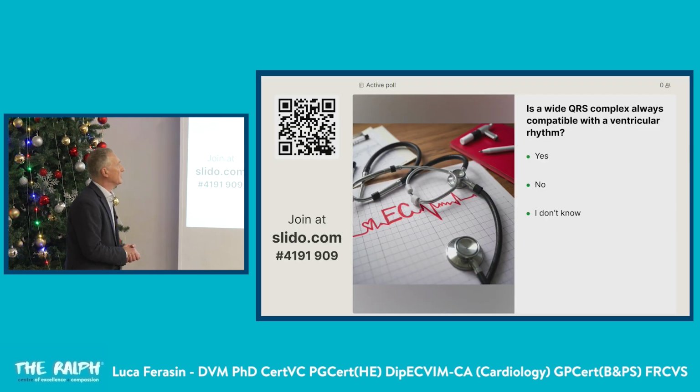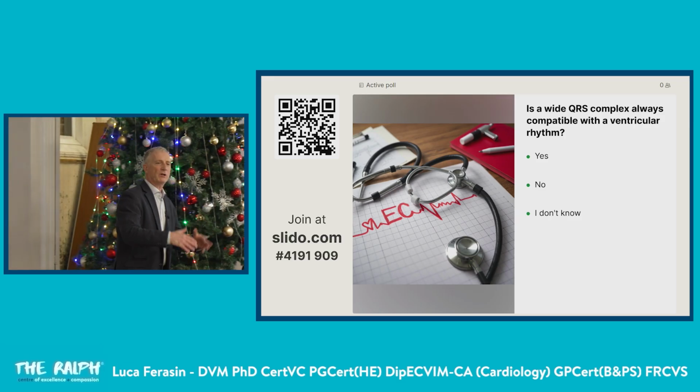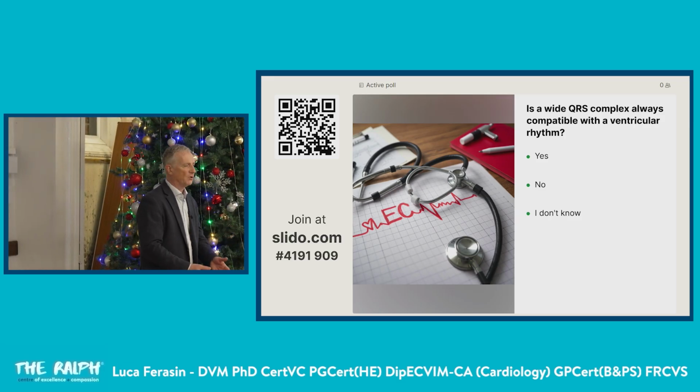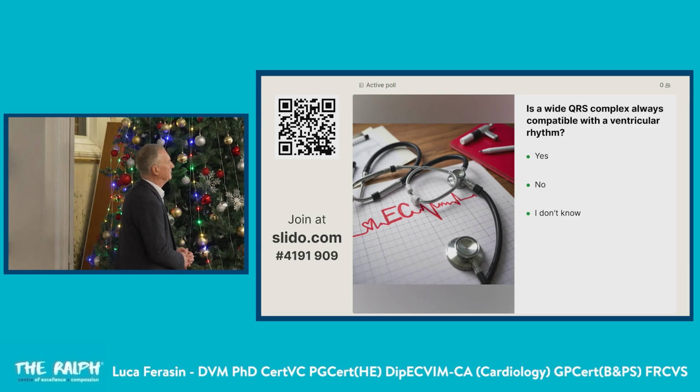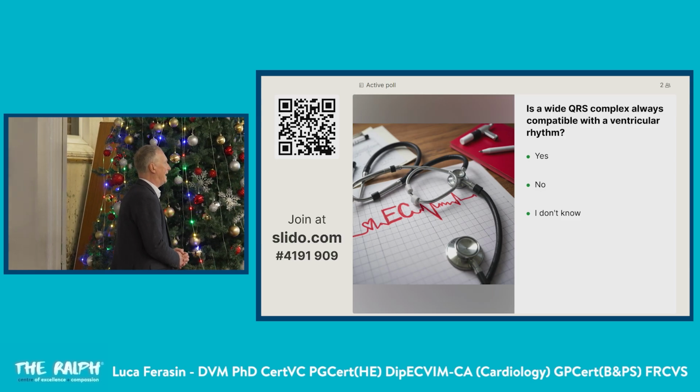There we go. So is a wide QRS complex, so more than 70 milliseconds in a dog or 40 milliseconds in a cat, always compatible with a ventricular rhythm? We can say yes, no, or I don't know.